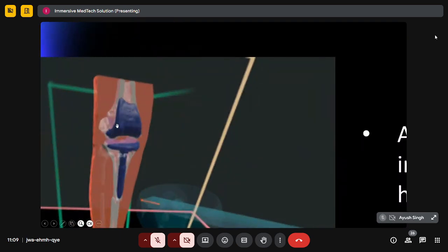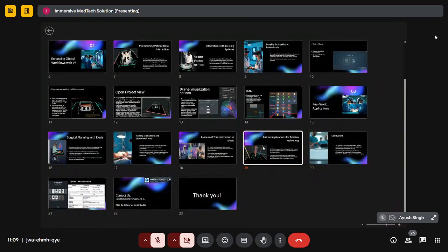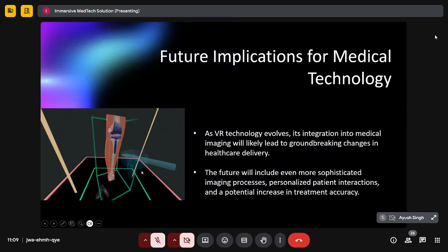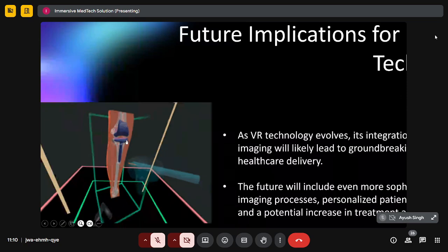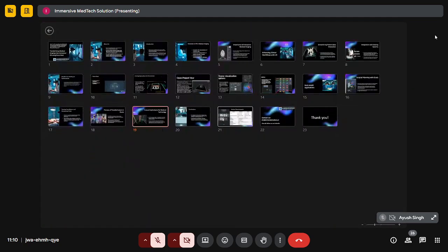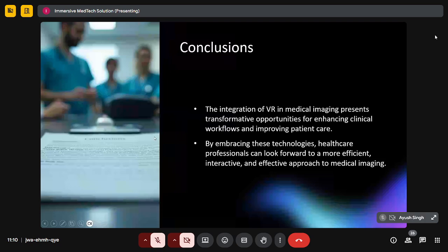For example, this was a total knee replacement, TKR, surgery that was being performed, and in this TKR, the implant, since it has a higher grayscale value, was identified, and it is positioned inside the data set corresponding to the image data. Furthermore, the precision is considered and a plate is set. This is all done in the software itself. So the manipulation and working of the data set becomes quite easy.